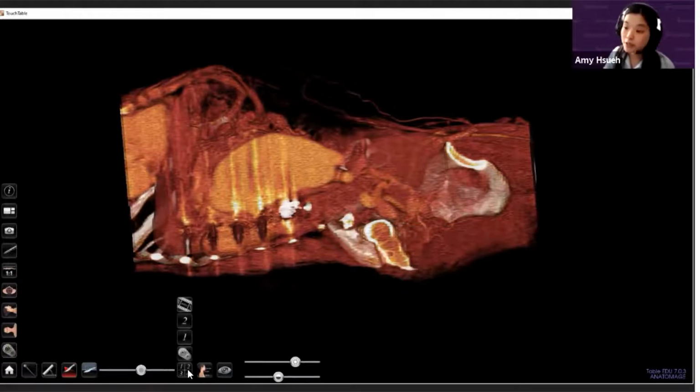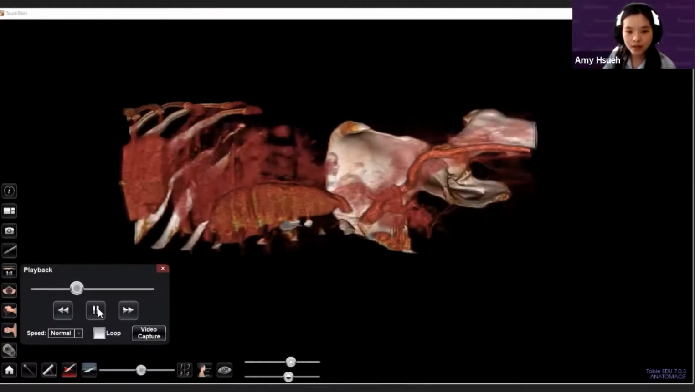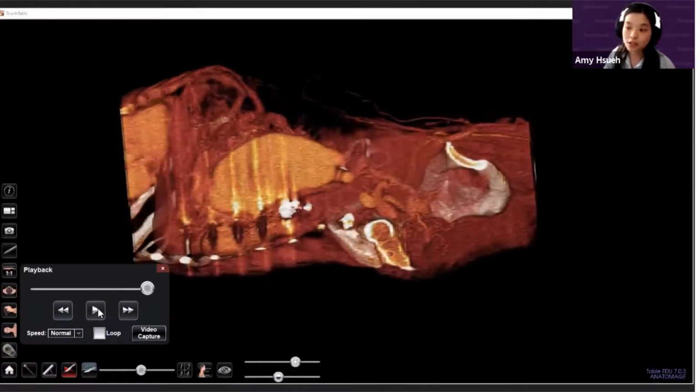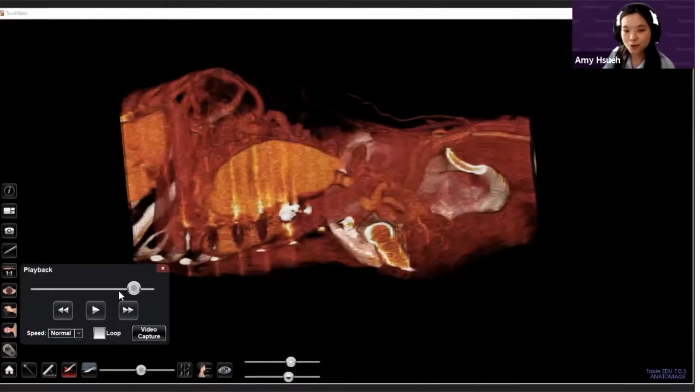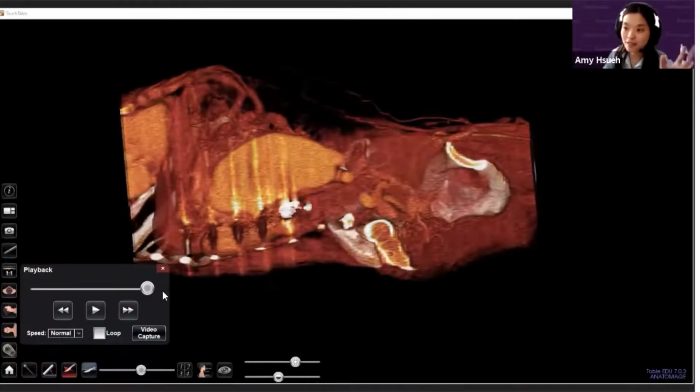And within the preset menu, you can actually play that back. So if you open it up, at the very top, you see this little film strip. If you click on that, that'll bring up the playback function. If you just play it, then it will actually play through each of the presets that you had created and move the scan around to make them match.